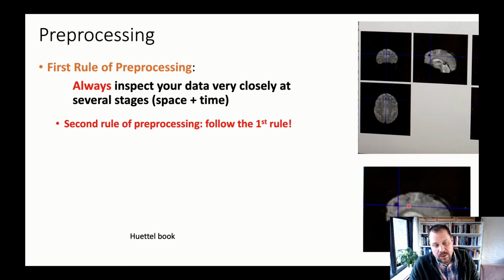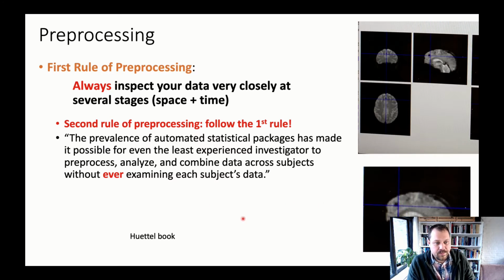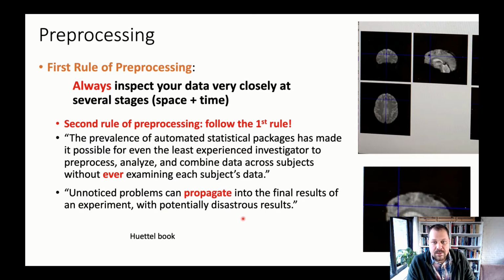But if you look at this brain more closely, you see that there may be other parts within that brain that have signal dropouts. So this is maybe a brain that we don't want to include because that's quite a large signal dropout here. And we ask you to do this, to look at your data very closely and report on what you observe, visually, simply, when you have a look at this.